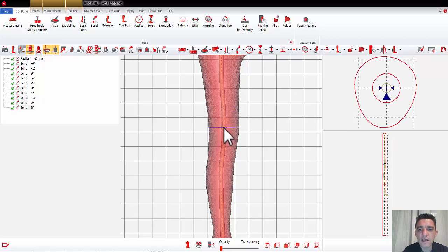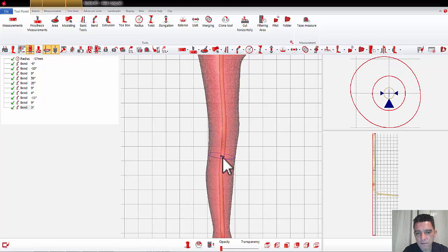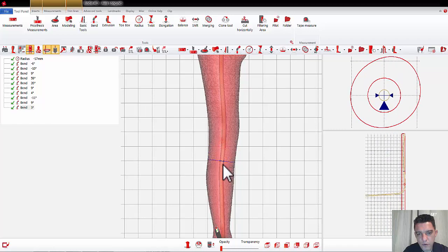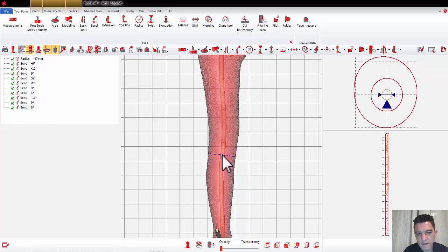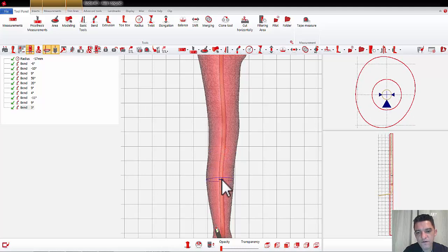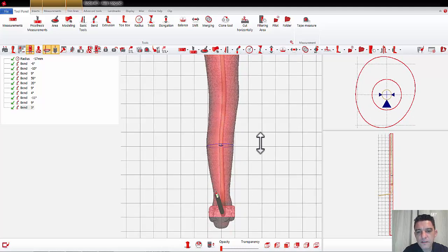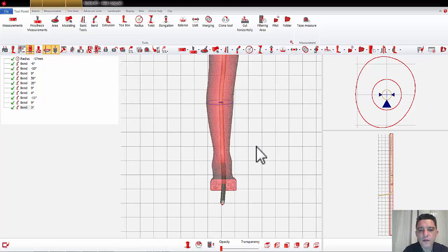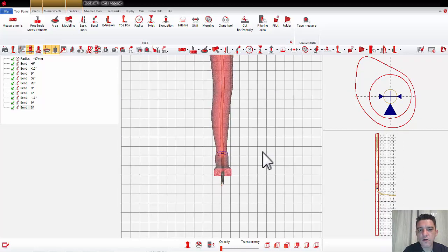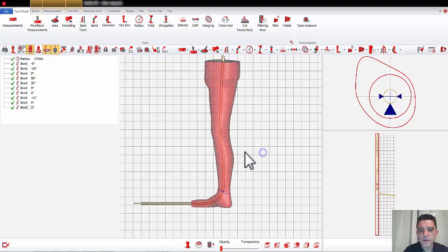Normally on the knee I like to leave straight. Look, for example, here. Imagine that if in your measurement protocol you have some inclination here, so you need to specify. This is one of the reasons that I prefer to leave straight, but I want to explain you many possibilities, I think. Okay, so everything is okay. From this view is also the same.